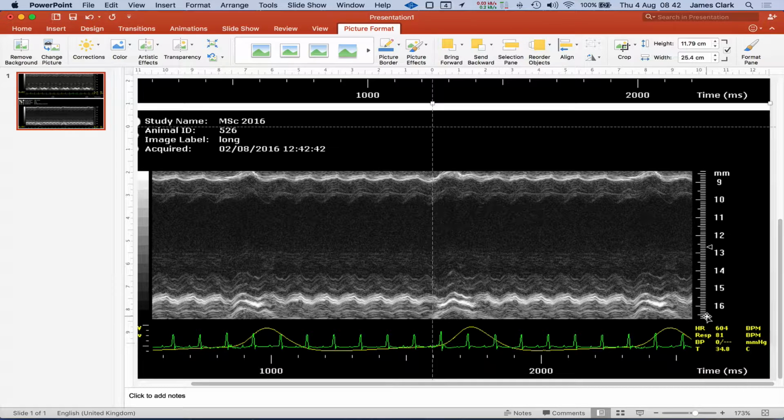And this is because these two hearts are different. They are from the same subject, but they are different time periods, and therefore some remodeling has taken place in this case. And so the heart is bigger. So when you've done the ultrasound measurement, your M-mode line spans a longer distance, therefore the scale is different. The way the software interprets the data is it puts the data into the same size window and therefore changes the scale here. This, of course, doesn't make a difference when you do the measurements because the DICOM images know what the scale is.